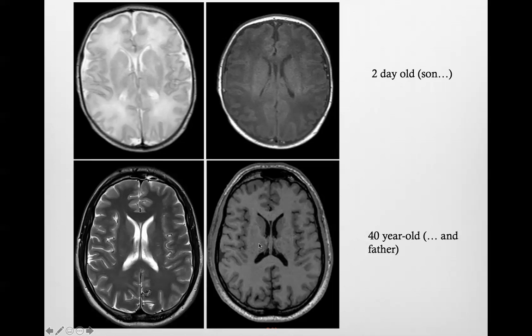And this is why, when we look at the scan, for instance, in a patient with epilepsy, we need to take into account the myelination that can give us some physiological blurring that can simulate focal cortical dysplasia. So remember that this is a brain that changes very fast.